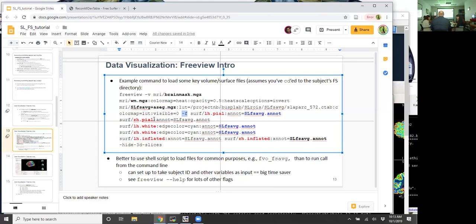And that same color table is used for the left hemisphere surface and the right hemisphere surface. So you have a precentral gyrus in the left and a precentral gyrus in the right, and those would have the same value. Let's say you're making a color table and you said, okay, index 3 is precentral gyrus. So in the annotation file, all the vertices that are in the precentral gyrus are going to have a label.